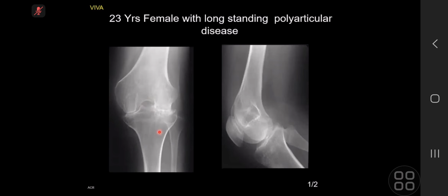So in summary, these findings would be in keeping with a history of either juvenile idiopathic arthritis or a history of hemophilia. Okay, so female hemophilia? No, male. Here you are. So that was a catch, and it has happened in the exam.